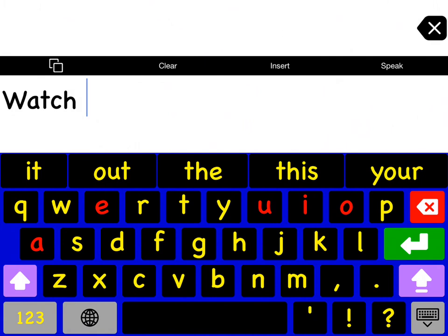What you're seeing here is just one of the configurations that you can create with Keeble. You can specify the colors of various groups of buttons separately. And here what we've done is we've created a high contrast theme for Keeble. So you've got the nice dark key colors and the yellow and red contrasting font colors. This is often good for folks with either visual impairment or cortical visual impairment, but you will need to consult with your teacher of the visually impaired or your ophthalmologist as to what colors work best for the person that you're working with.